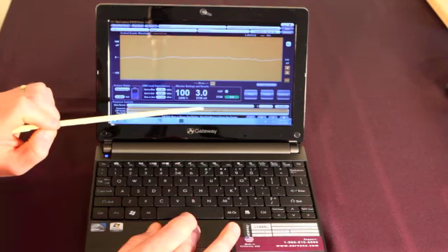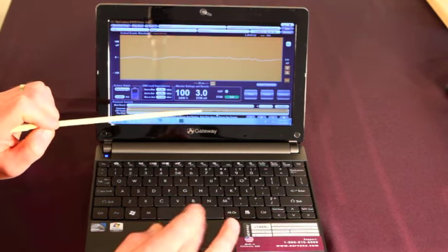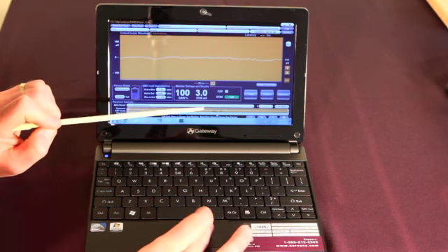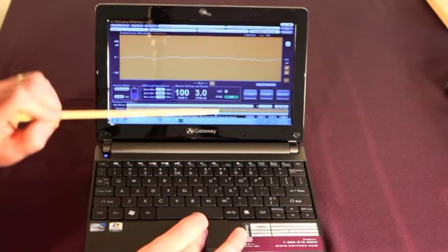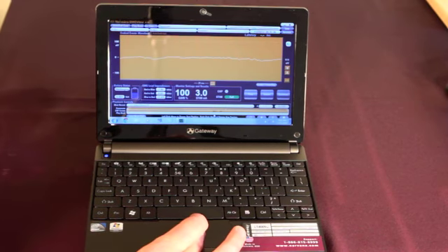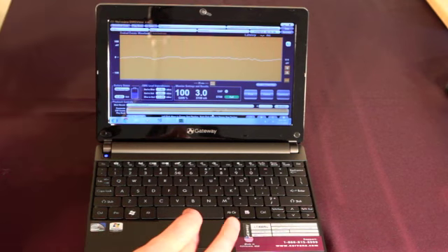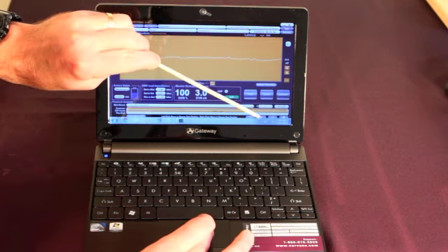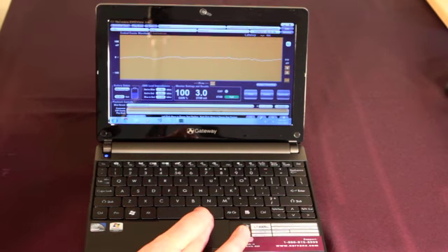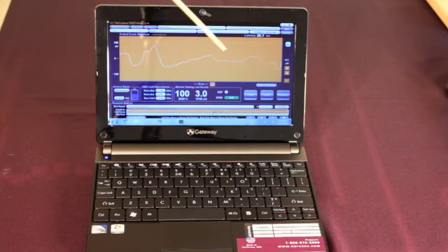Now what's happened is that green bar has shifted. Next thing I'm going to do is over here, I'm going to right click just beyond it and shift the red bar from the end over to here. Now I have a very small area which happens to coincide with many cap events that I'm going to review in more detail. Now going back down and clicking on the play button, you can see that now I'm getting data changing across my screen. This is part of my playback file.